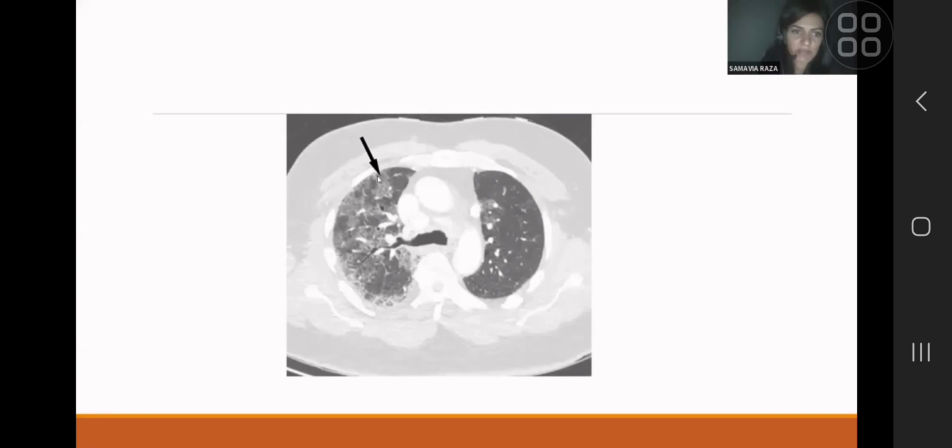Yeah, so if you notice where the arrow is, you see that there is ground glass and you see thin lines going through that area. You can see the lines of the septal thickening more prominently elsewhere, but even in that specific spot, you see lines and ground glass. So that is indeed crazy paving. This is actually a case of ILD, but that specific area that I'm showing you is a focal appearance of crazy paving. So well done, Farheen and Hamid.